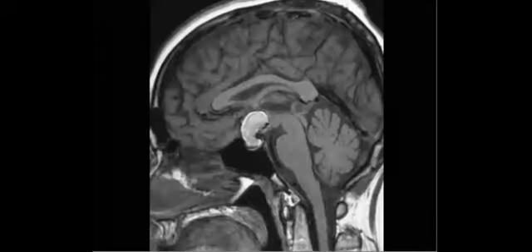Sometimes maybe you can skip this. Okay, let's take this one, which is in neuro, in the pediatric age group. Then you find a suprasellar mass. So what is the differential? It is hyperintense on T1, either hemorrhage or fat. Craniopharyngioma. Yes, so it will be with this cystic appearance and the high T1 signal.